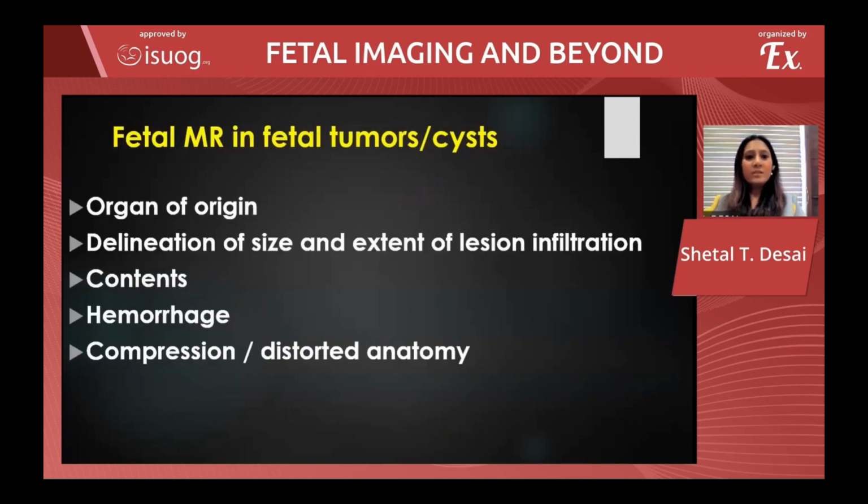MR in fetal tumors and cysts helps not only in getting closer to the organ of origin, but also helps in identifying the extent of the lesion, contents, and distorted anatomy. So there is a huge list, but I would only be taking you through a couple of them.